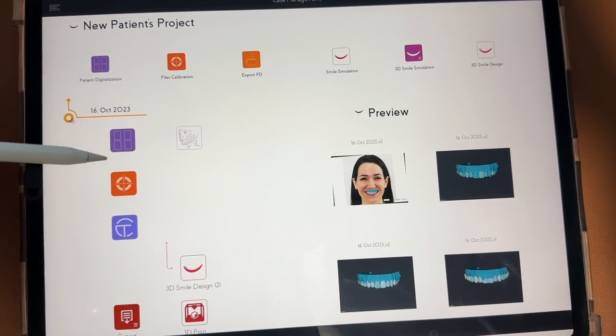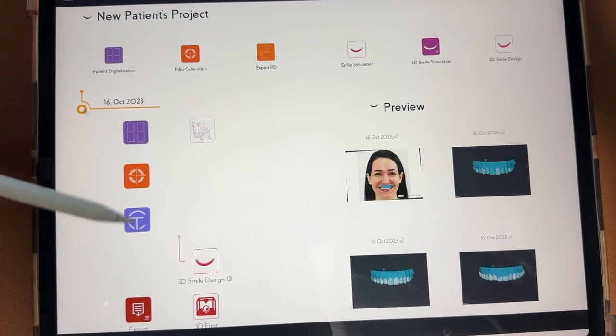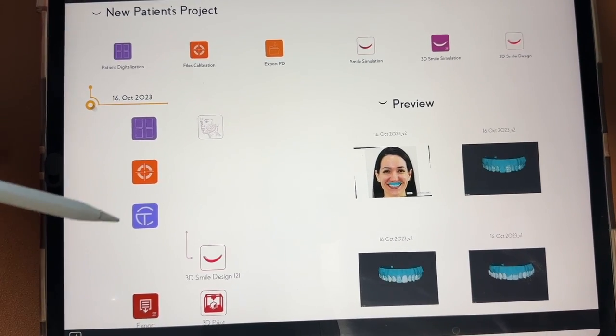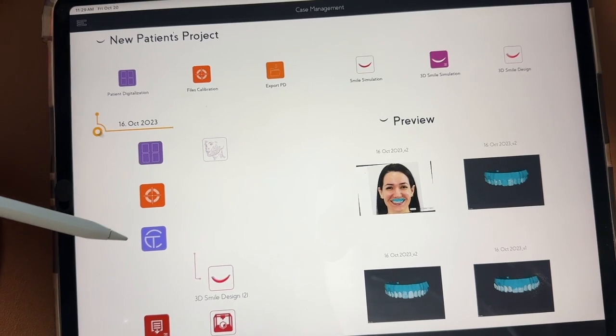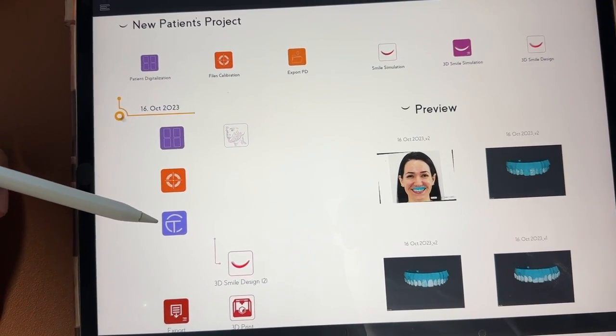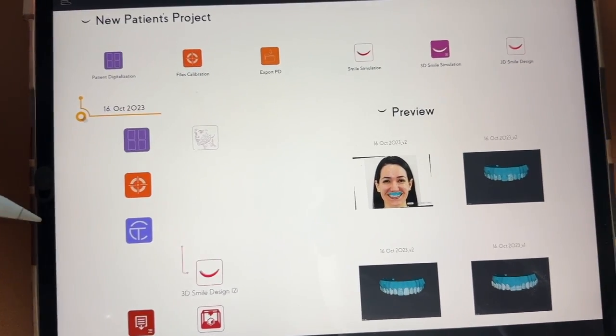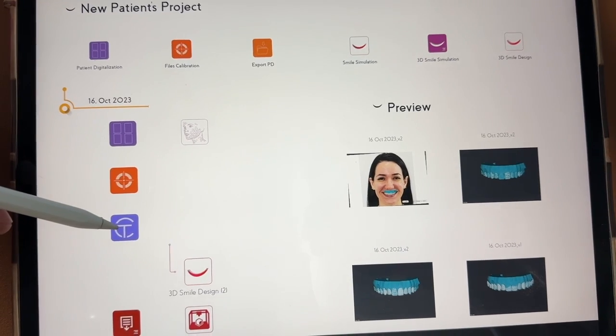so that we can go back into the patient's folder. And once you upload the folder, you will find this icon over here, okay? So this is the CBCT viewer icon. So once you click in here, you will be going into a new page where I will explain to you how to navigate. So let me click over here.